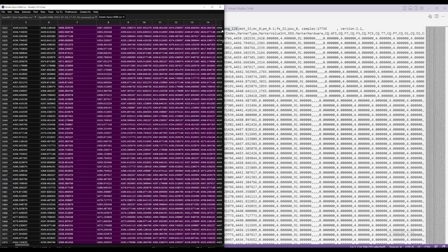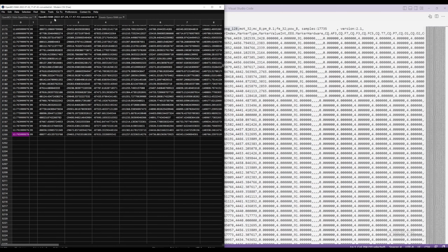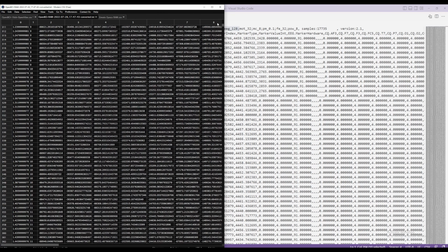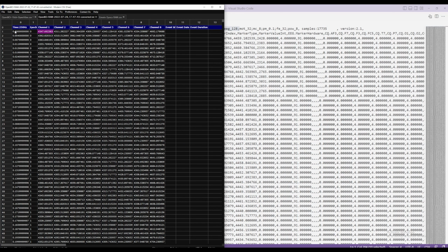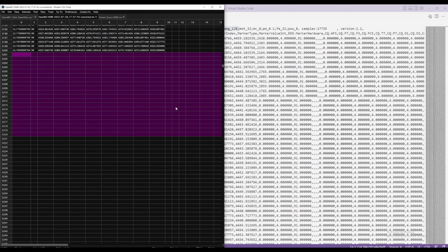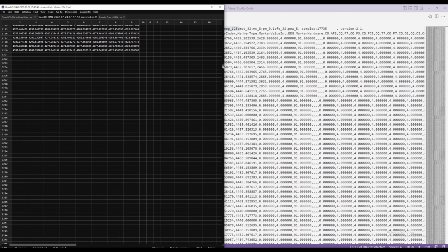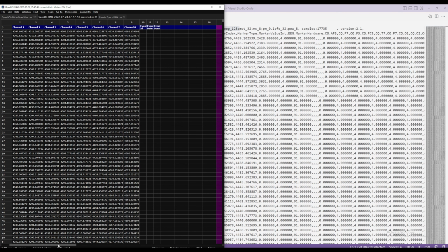And just copy. And go here and replace the ones here. There we go. It should exceed by, yeah, so about 20. Let's just get rid of it. Let me just remove the row to make sure it's not making any extra commas anywhere. But yeah, this should be read with no problem.